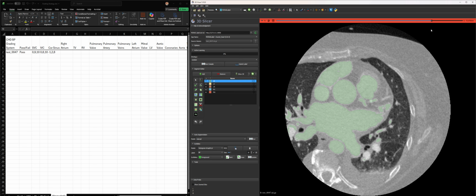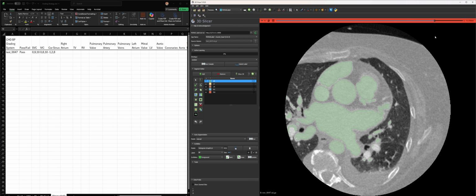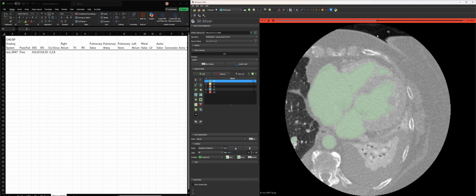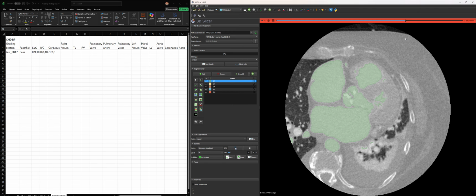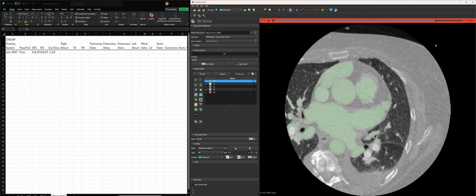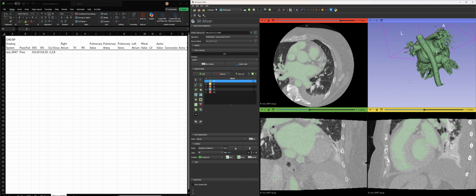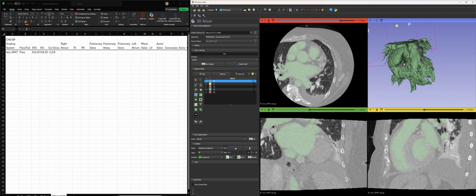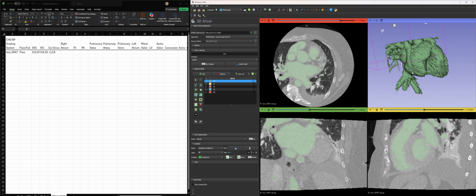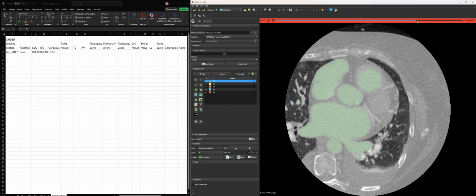Yeah, I think this is a PAPVR. So that's why, and an ASD, two defects. So anyway, if we're focused on the right atrium, I'm curious about the right atrial appendage, how well it's captured. And again, it looks pretty good. If we're going back to this, this tells me, oh, that's a good right atrium, right? And then over here, I come in and get into the nitty gritty of it.